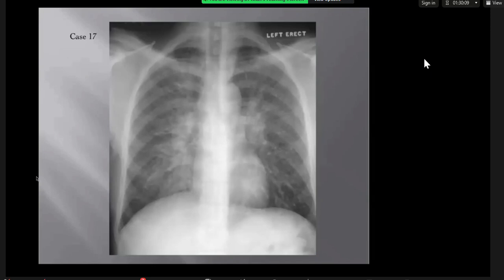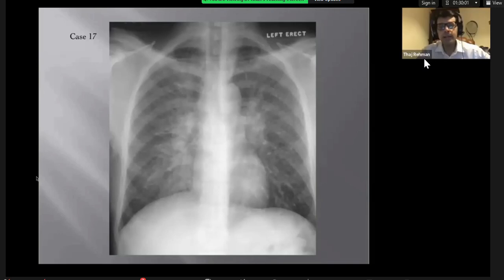There are also some increased interstitial markings on both sides, but the pattern is more... If you see more and more X-rays, you'll get your eyes used to differentiating acinar shadows and interstitial shadows. Acinar shadows, I will be elaborating on this later. Acinar shadows, to this degree, if they happen, they'll coalesce together, and they will be more like nodules.